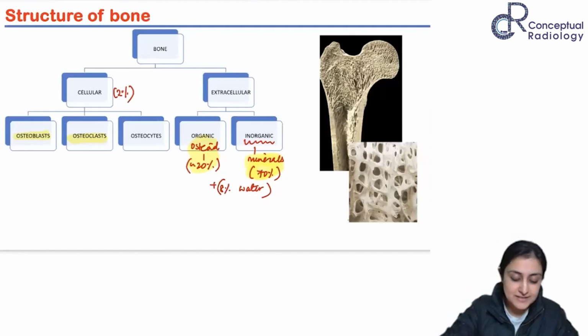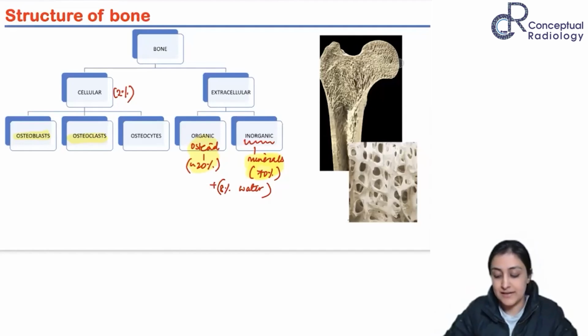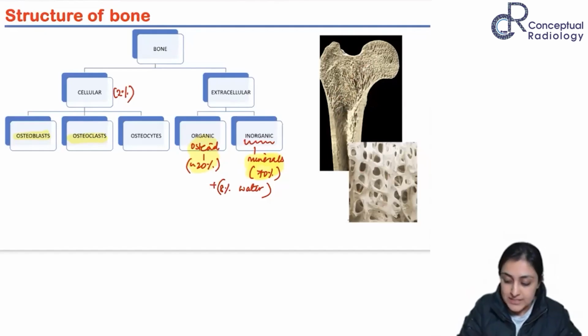So the cortex is the solid bone here, which is rarely ever involved. What is more commonly going to be involved here is the trabecular meshwork. Something interesting: it only constitutes 20% of the mass. It is very, very loosely organized.